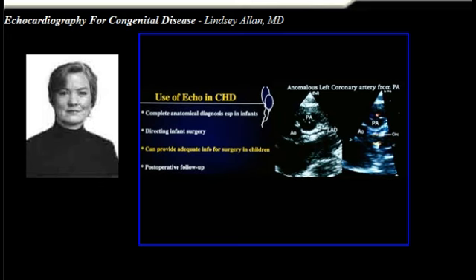And at surgery, our surgeon told us that in fact there was fibrous continuity between the coronary artery and the aorta, but at this last moment the coronary artery turned directly posteriorly and plugged into the pulmonary artery. But it was a very difficult diagnosis to make. We were obviously very anxious that we'd sent this child to surgery with an incorrect diagnosis, because we didn't look forward to meeting our surgeon after he had found that out. Fortunately, it was in fact an anomalous left coronary from the pulmonary artery, but the clue was in the careful evaluation of the colour flow map.